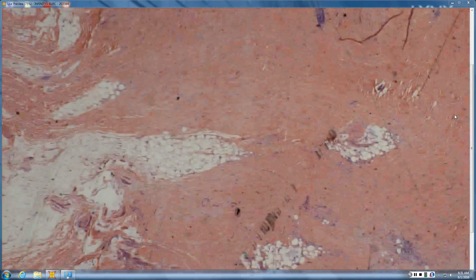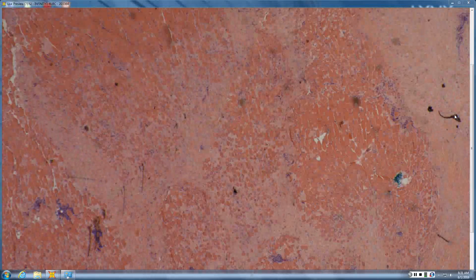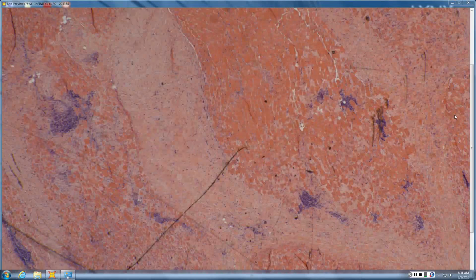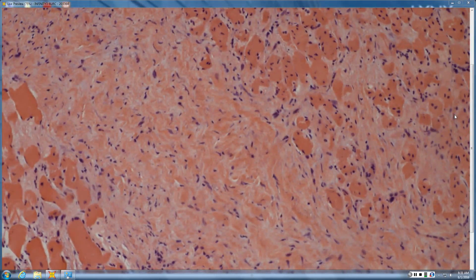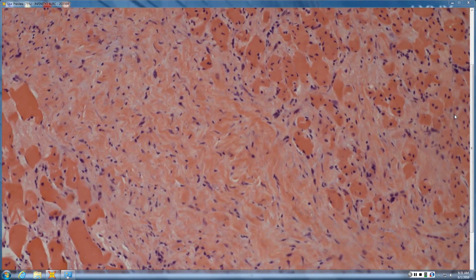There's no epi. In fact, all of this stuff is muscle, I think, skeletal muscle. So this is deep within skeletal muscle. And you have lymphoid aggregates, and you have new ropey collagen and spindle cells, and this whole thing is a squamous cell carcinoma. Every spindle cell you see is squamous cell carcinoma. Just as there are desmoplastic melanomas, there are desmoplastic squames that function like fibroblasts and make collagen.